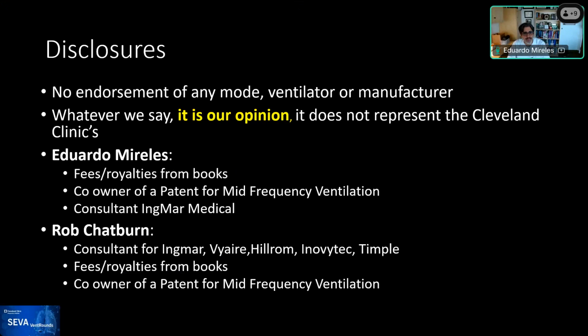It just takes a fair amount, but we don't have any way to measure it. So if you say it's normal to your eyes, that's okay. But I see it dropping from here all the way to here, from here all the way to here. You see how long it takes for it to trigger? So I would say that these are probably late triggers because there's a fair amount of time from the moment that the pressure and the flow start changing to when it activated. So I would vote that these ones are late. But there's an argument against that though, Eduardo, because the patient is breathing in while he's breathing out.